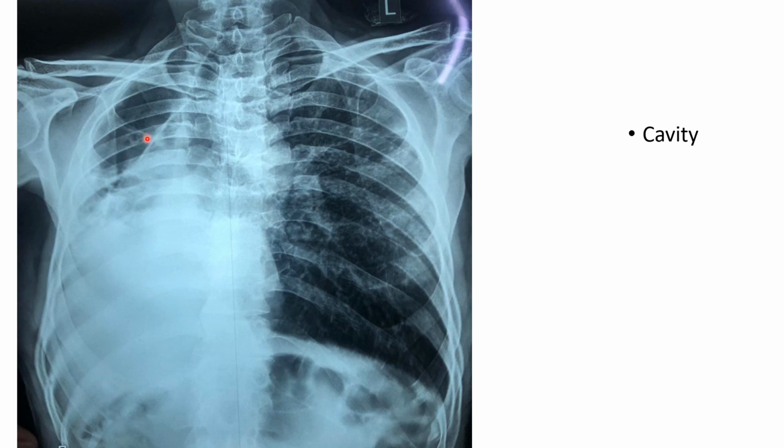So again, as I said previously, this we saw in another x-ray, which is a cavity. Here also it is a cavity, so don't mistake it for pneumothorax and put ICDs. See the trachea is pulled to the same side. If it had been pneumothorax, it should have been pushed. See the mediastinum, heart shadow. This is the left side. The cardiac apex should be somewhere here, right?